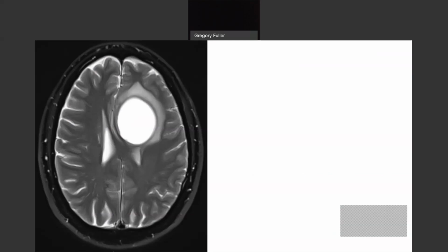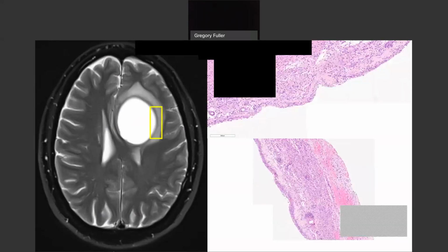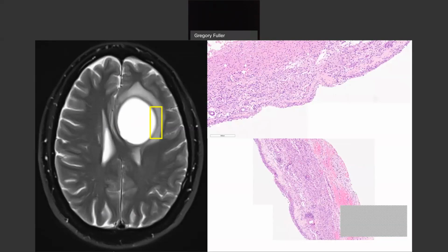Now, this could have been a cystic meningioma. It could be a cystic schwannoma. In this case, it's a cystic intraaxial lesion. The pseudoepithelial lining looks the same no matter what the tumor. All right, that's an important lesson. Okay, so there it is. There's the lining, the wall of the lining, we're looking at it right there. How beautiful is that in terms of putting the pieces together?